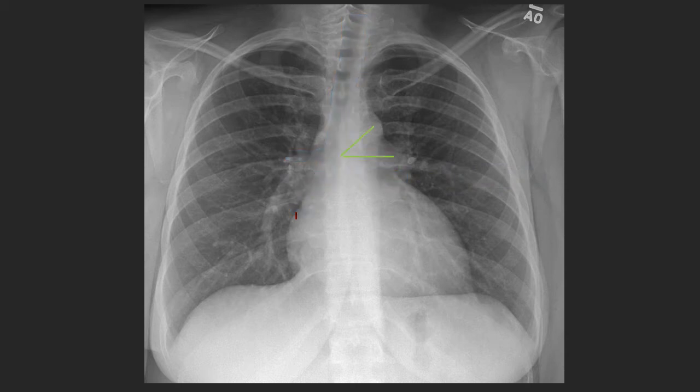One thing that we're challenged with on frontal radiographs is to find the carina. That's one of the more important things that clinicians want to know in regard to the location of their endotracheal tube. Sometimes we can just see the branching of the airways, as we do in this case, in which case the branch point is the location of the carina.